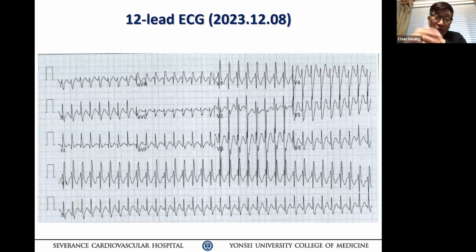So that also opens the discussion about whether this could be, as we said, some sort of a tachycardia, ventricular tachyarrhythmia with intermittent dissociation. That's also possible here, right? 근데 이제 what determined that summation effect? Let's say this is SVT. That's a diagnosis. Let's assume that's correct. If your RR interval changes, then we could have a transient sort of, not dissociation, but a timing difference between two activations.